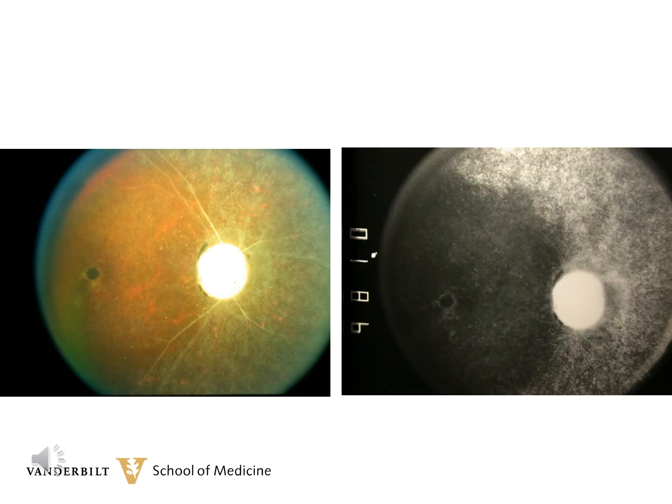And in our final example of staining, this patient unfortunately had an ophthalmic artery occlusion resulting in no light perception. On the clinical photograph, you can see an incredibly white nerve. All the vessels are white, and there are also some panretinal laser scars temporally. So there's some hyperfluorescence from the scars, but the main one to point out is this nerve also is very hyperfluorescent because the lamina cribrosa is picking up the fluorescein and staining with the fluorescein dye.